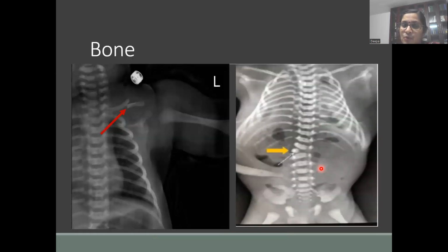So in the structured approach, we are done with the A part, which included the airway, the hilum, the mediastinum, and the lung shadows. Now coming to the bone, B stands for bone. So have a look at both the clavicles, the long bones, the humerus, the ribs, and also not to forget the vertebral body.